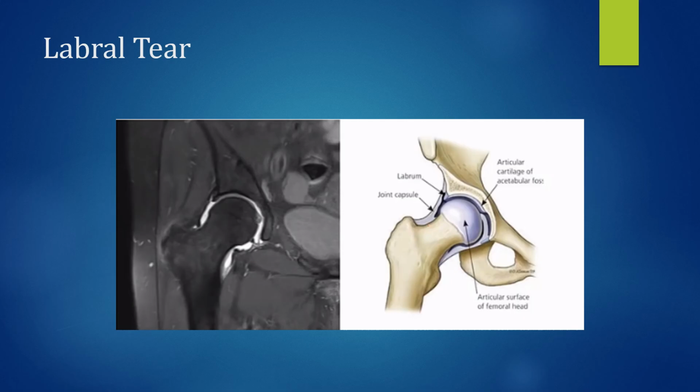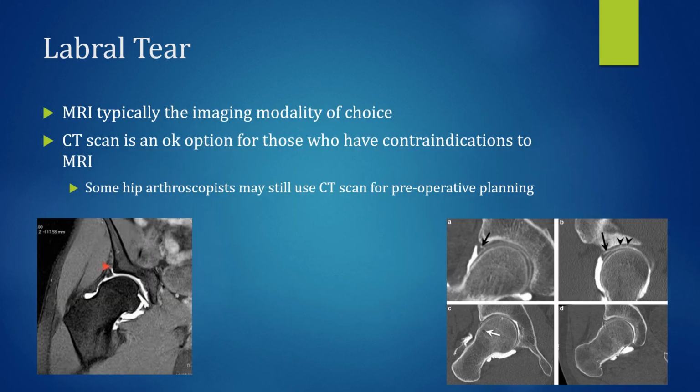Up to now, we've been focusing a lot on bony morphologies. Let's transition now to the acetabular labrum. The most commonly injured aspect of the labrum is the anterior superior portion, which is what we're going to primarily focus on today. Also, remember that just as in other joints that we've looked at, there is a ring of articular cartilage within the acetabulum as well.